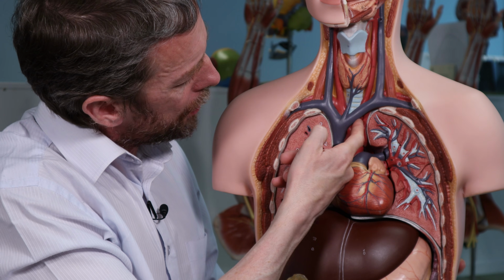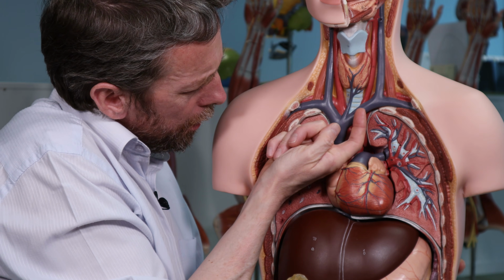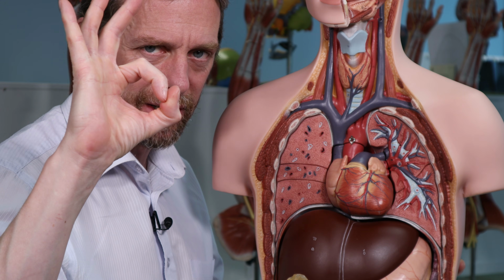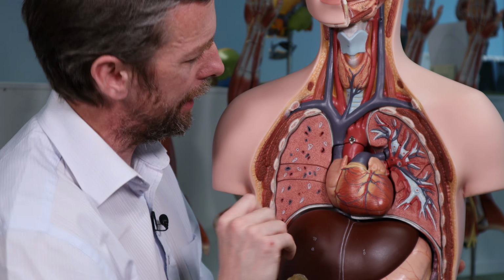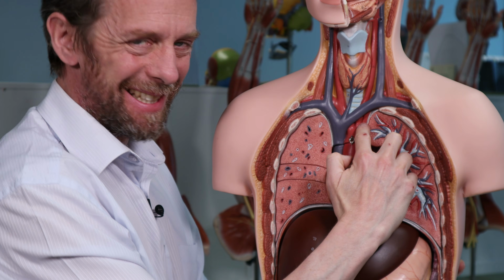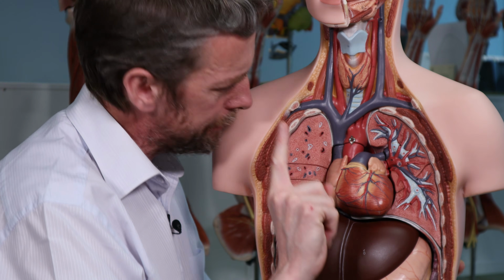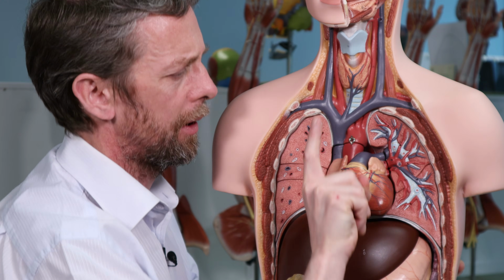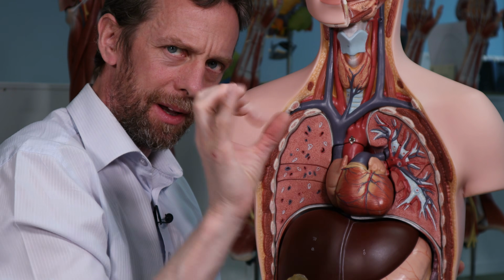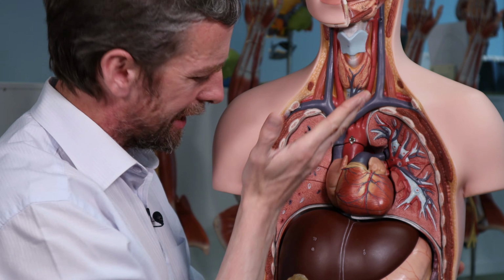And then the second branch is the left common carotid artery, which is going to go almost straight up. So if we cut a section through that, it should look pretty round, right, in most of those levels. And then the third branch is the left subclavian artery. So that starts going up fairly straight, and then at some point it's going to go off to the left to get to the left upper limb. So when we cut a section through that, that's going to change its shape, isn't it? That's what we're looking out for.